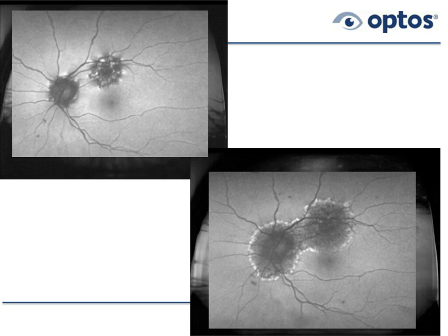We mentioned one, but the important factor is, is the fovea threatened? And if you look at the image, which is to your right and below, part of this lesion, the bottom part, seems to not have a bright band, so hopefully that won't spread into the fovea. I've seen this patient since this image was taken, and it seems to be about the same. So there is an inferior field defect associated with this superior lesion, but it hasn't quite gotten to the fovea, so her acuities are still pretty good.